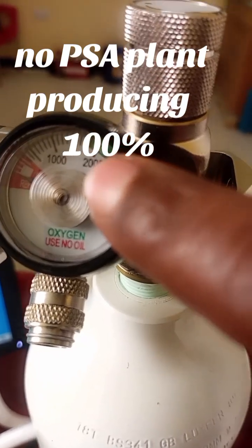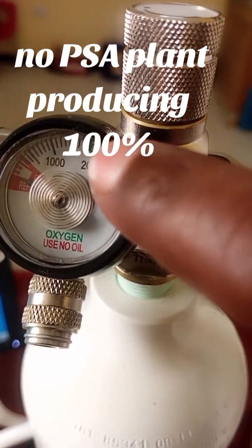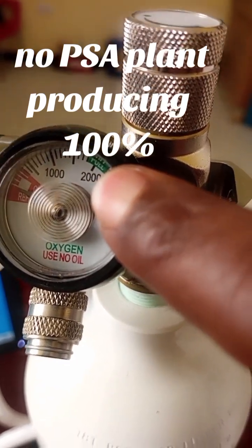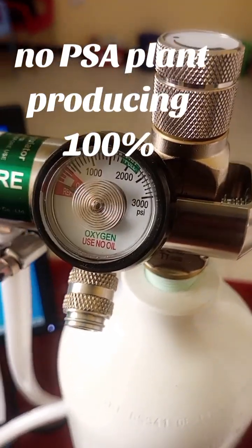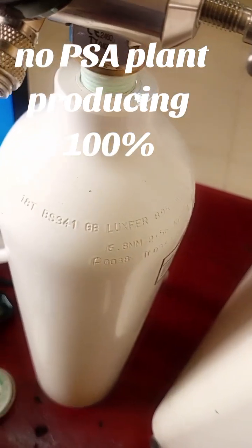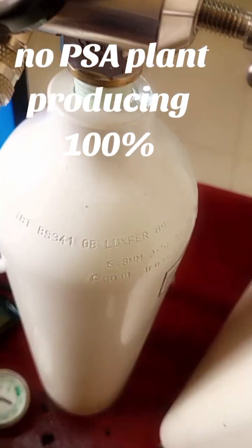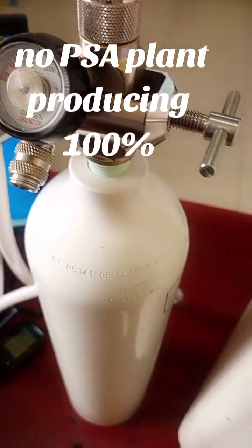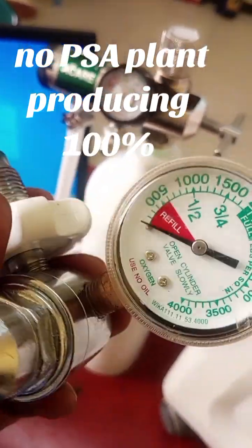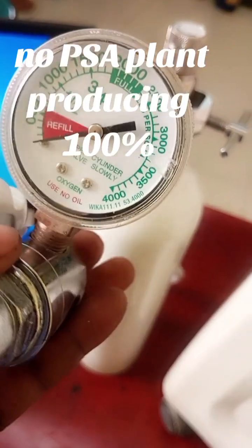Here, if the arrow is at this indicator, it means your oxygen gas cylinder is full. We have many types of oxygen gas cylinder, but I wanted to show you the gauge. This is the pressure gauge.